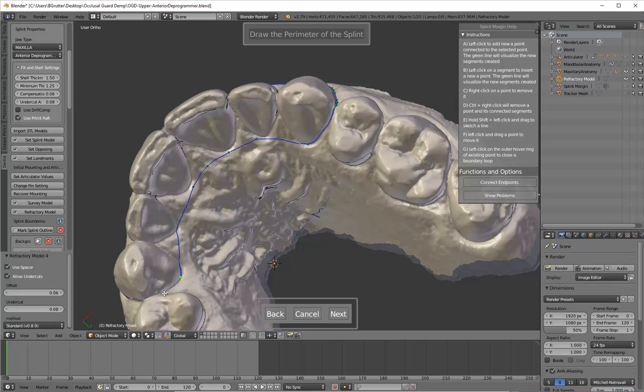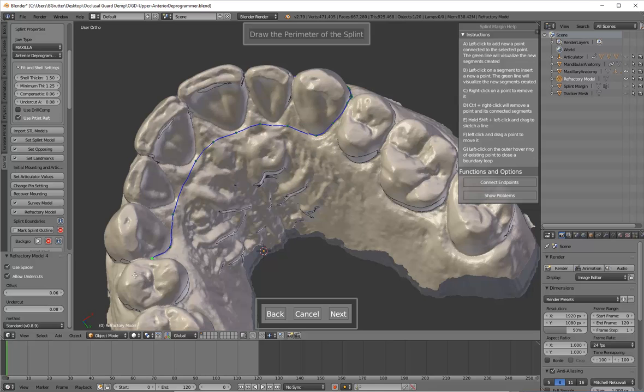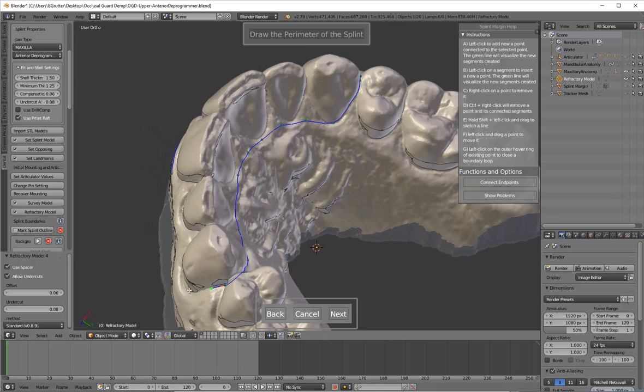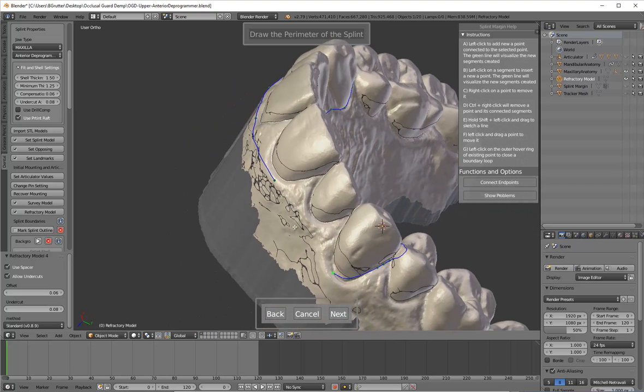You can always go back and say, oh, I didn't need that node. Let's just delete that. Right click on it. Oh, I want one. Let's click one there. Unfortunately, now this one is bright green, which means any node I try to draw, it wants to connect to that. So I want to come back to this last one, just click on it, and now it knows to connect any subsequent dot to it. The software's gotten pretty good at being smart about fixing those little imperfections.